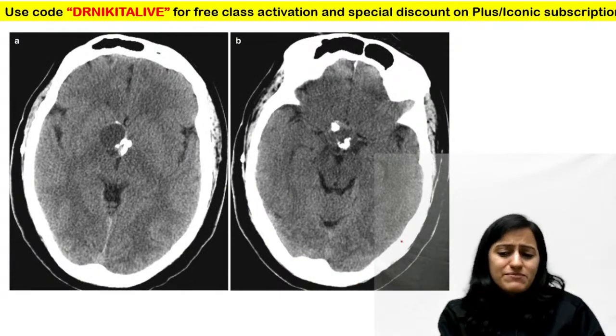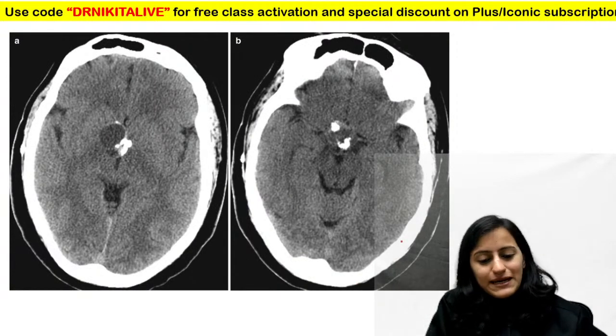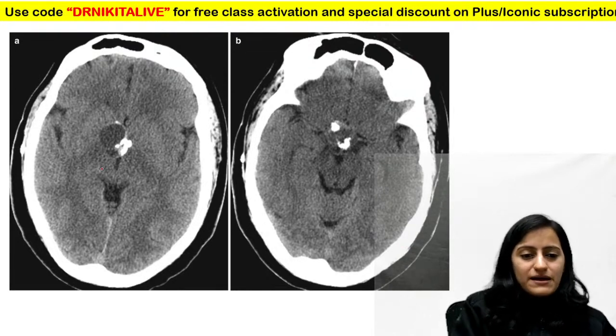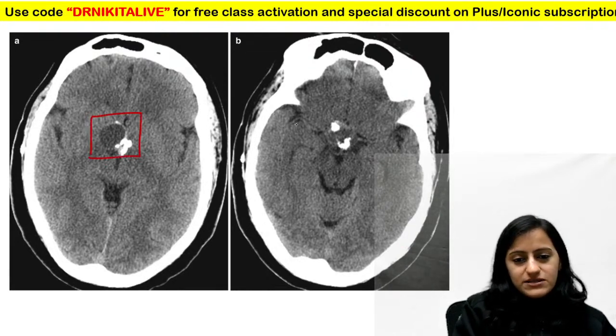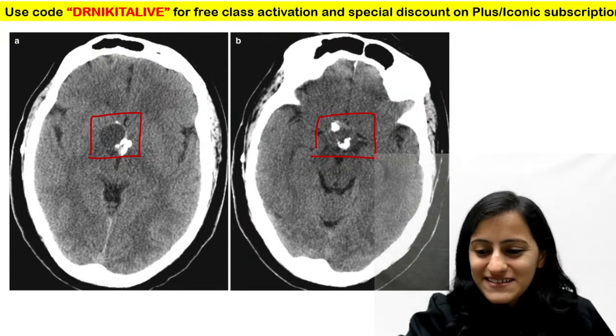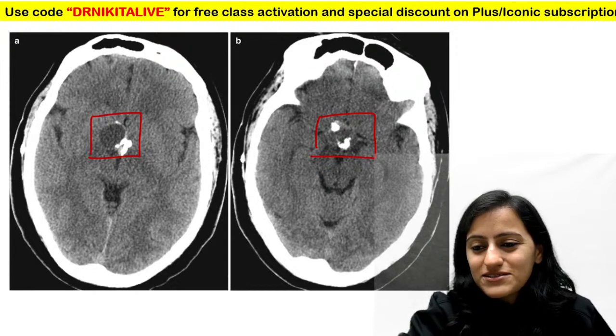Next one, can someone make a diagnosis here? Let's see who can make a diagnosis in this image. I'll tell you where the pathology is. This is the area which is abnormal. Let's see who gets this right. What do you think is the diagnosis in this case?